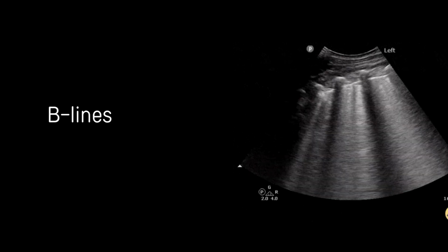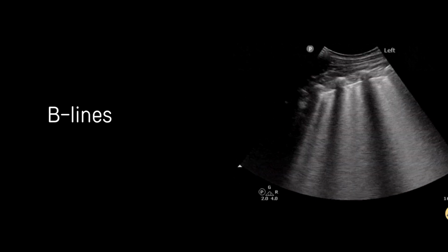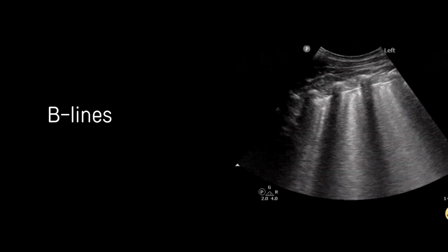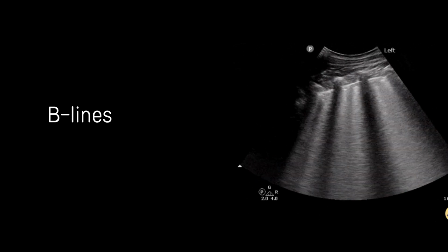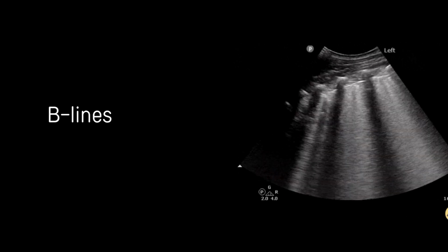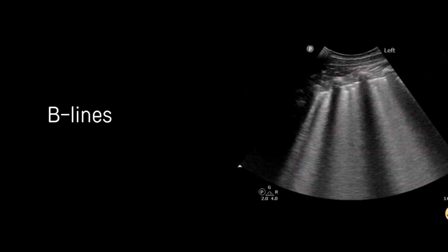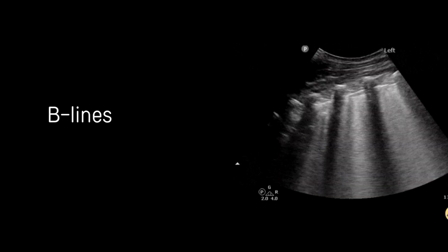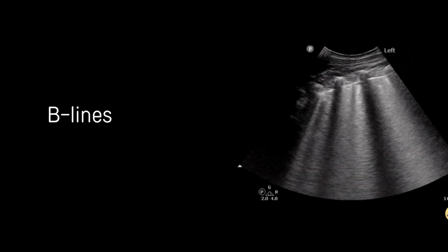B lines. So what are the causes of B lines? So pulmonary edema. Okay, well, let's say consolidation. I'd say infection. Okay, yeah, what else? So what can cause fluid? Pulmonary edema. Okay. So all the viral stuff is going to give that to you. PJP is going to give that to you. So there's a lot of things that give you that.